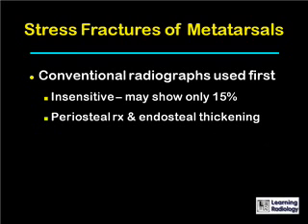Conventional radiographs are almost always obtained first, but they are relatively insensitive, especially early on, in demonstrating stress fractures of the metatarsals. Within the first week, they can show only about 15% of all stress fractures. When they are positive, they demonstrate periosteal reaction and endosteal thickening.